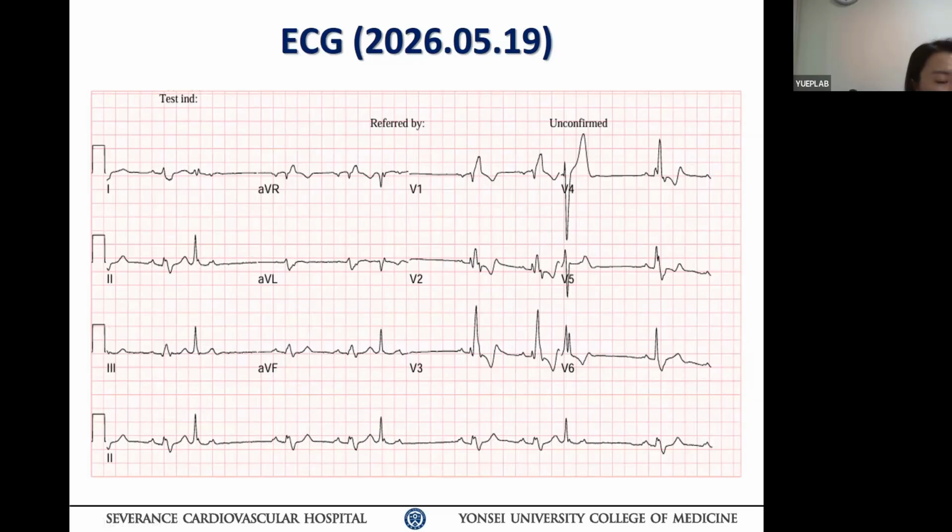Okay. But looking at this patient, the right bundle is pretty wide. This is most commonly seen in two conditions, as the differential diagnosis. One is congenital heart disease, post open heart surgery. Number two, Ebstein. But it doesn't look like Ebstein. The axis is not right. So maybe this patient has had some right ventricular, right-sided surgery for congenital heart disease, something like that. So you can speculate that, okay?